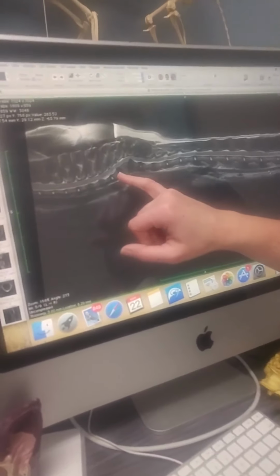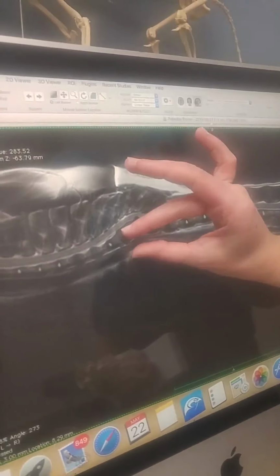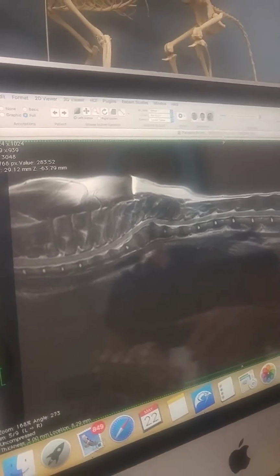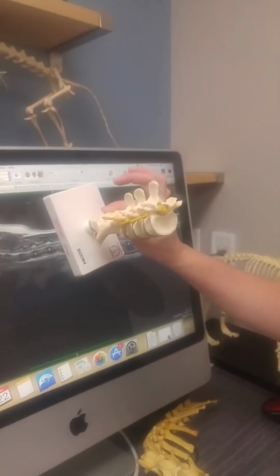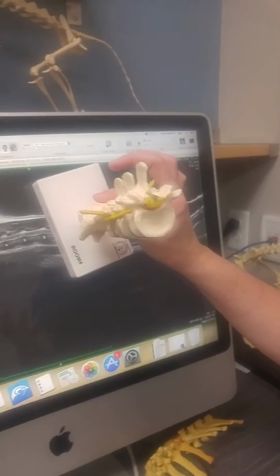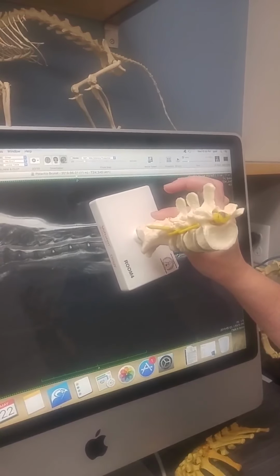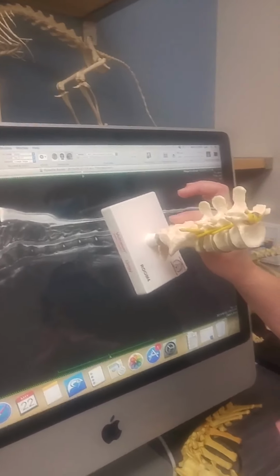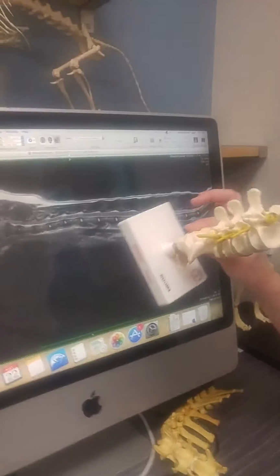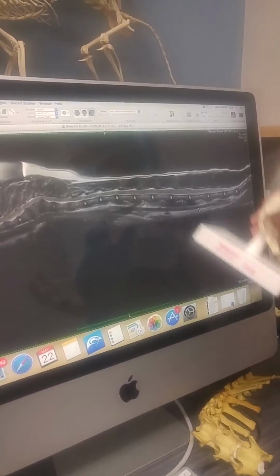But what we see as well is a little black bump there, interrupting my white line underneath. You probably see that, and the shape of that looks weird from the start. So now we want to know, in that view, what does it do to the spinal cord? Because that's the answer we're always trying to find, since that's how we decide if it's medical or surgical. If something is compressing the spinal cord, then often our option to reverse that is removing the compression.